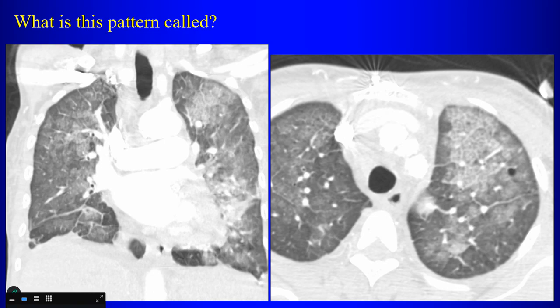Why do you look at that and say, that's crazy paving? What is it about this? Because there's intralobular and interlobular septal thickening? Yeah, so you have ground glass opacity with interlobular septal thickening, right? But there's also intralobular septal thickening. There's reticularity actually inside the secondary pulmonary lobule. So you have ground glass with interlobular and intralobular septal thickening. It's geographic, meaning that there are areas of the lung that are also spared. So that appearance, when we see that, we call that crazy paving.